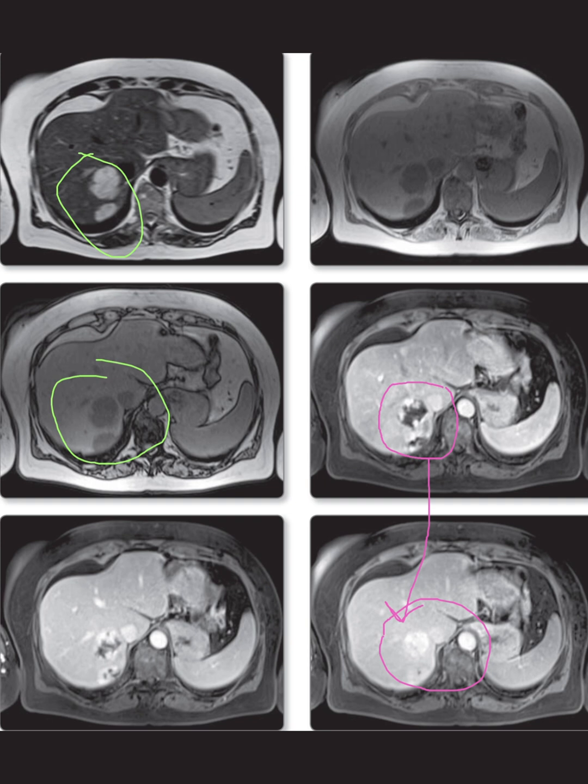Finally, it's worth mentioning that cavernous hemangiomas, while benign and often asymptomatic, can sometimes present with atypical features that make them appear nonspecific on imaging. However, the typical features we see here on CT and MRI, including the filling-in pattern from the lesion's periphery, are consistent with the benign nature of these lesions. The risk of complications is generally low, and intervention is rarely needed, unless the patient experiences symptoms or complications arise.